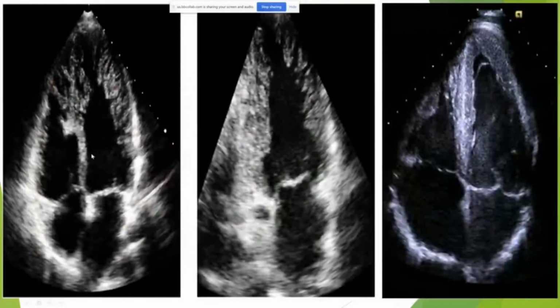So the trabeculations I was talking about, this is what they look like right here. See how the muscles appear striated and they're separated? They're not in one. This is what a normal myocardium would look like. And this is what trabeculations look like. Also, if they have an ejection fraction of less than 40%, they have non-compaction cardiomyopathy. So take a look at these muscles and take a look at this one. This definitely looks normal. These definitely are abnormal. So again, these are trabeculated myocardium, and this is a normal compacted myocardium.